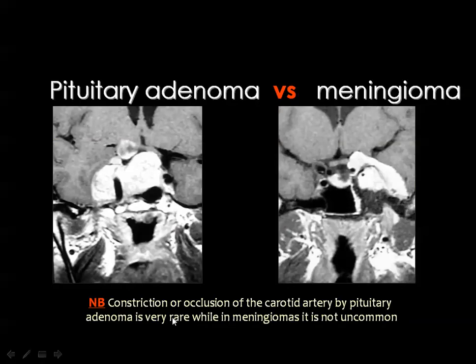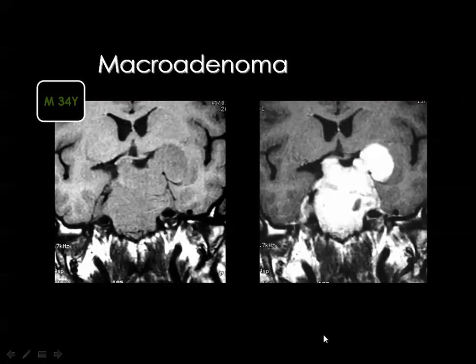Then this is the difference between the pituitary adenoma extending into the cavernous sinus and the meningioma involving the region of the cavernous sinus. I have mentioned that the pituitary adenoma does not affect the caliber of the internal carotid artery nor its patency, while meningioma is usually associated with cuffing of the vessels and attenuation of the lumen. This is one of the differentiating points. There are too many differentiating points between both. I will mention them in the part on parasellar imaging.